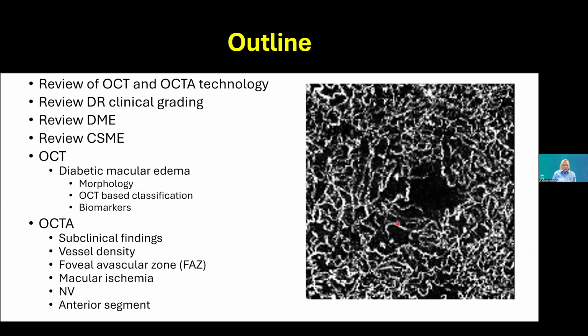We're briefly going to review just how OCT and OCTA work, review clinical grading of diabetic retinopathy, and then we're really going to shift and focus on diabetic macular edema because OCT has really made such a difference here, and we even have a new OCT-based classification system for diabetic macular edema. And then we're going to move on to talk about OCTA.